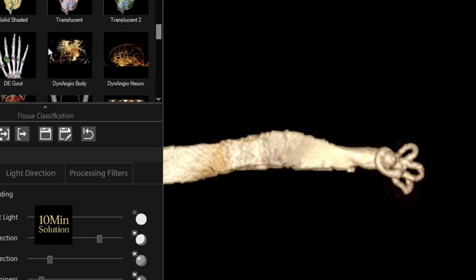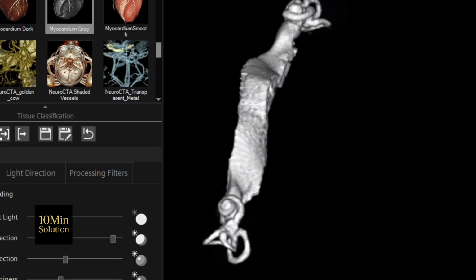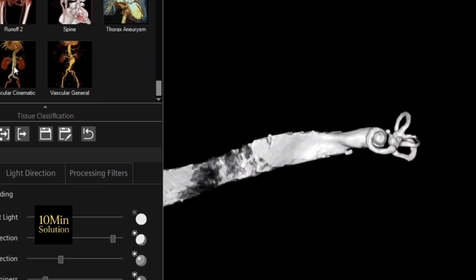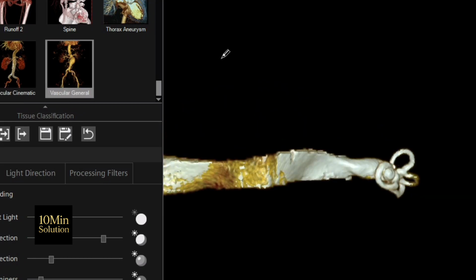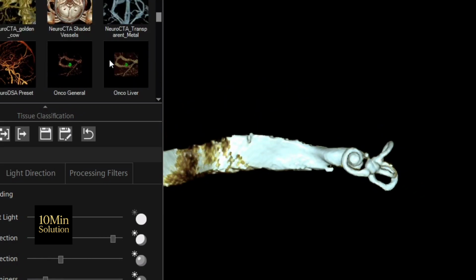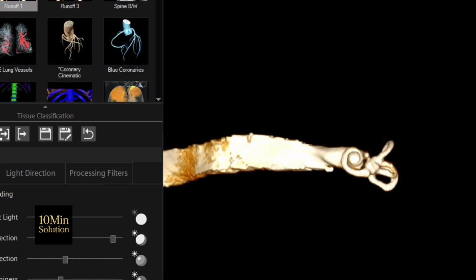Image export and reporting. Finally, processed images are prepared for reporting. Key images are selected and exported. Proper labeling is ensured. They are included in the radiology report. Professional reporting ensures better clinical decision-making.